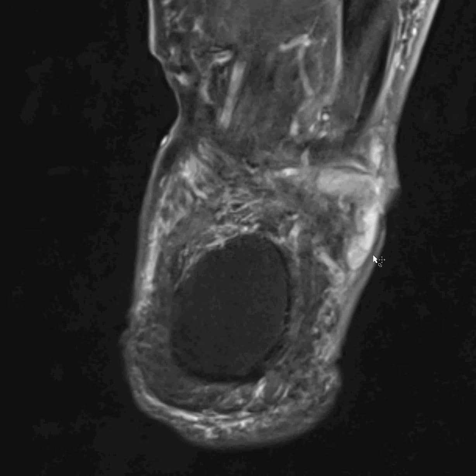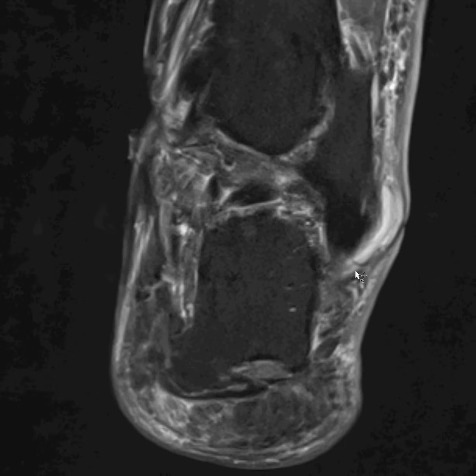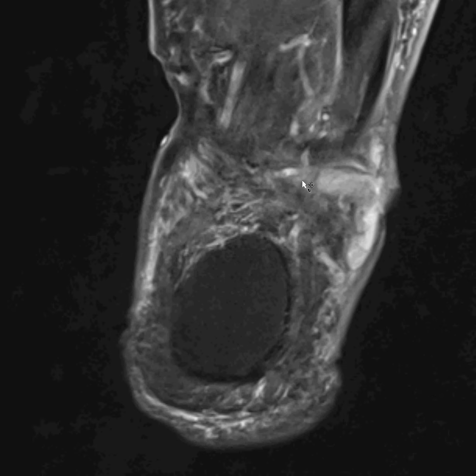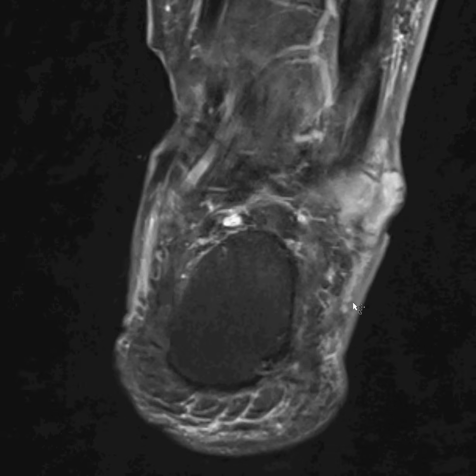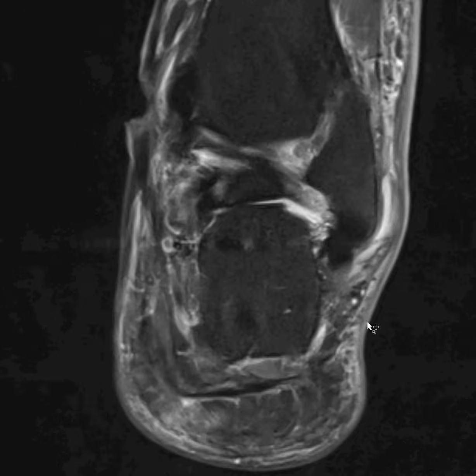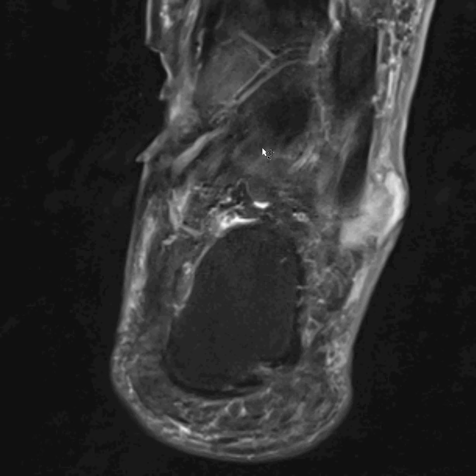The problem is, this is the only plane that we see this in cross-section, and you can see it kind of comes back posteriorly, and it's not clear what its relation is to this tendon sheath or where it is. An axial image through this area would reveal this, and if you know where the ulcers are, you should always try to cover it in cross-section. So in this case, these ulcers would have been best covered by both this plane, which we'll say the coronal plane, and also the axial plane.